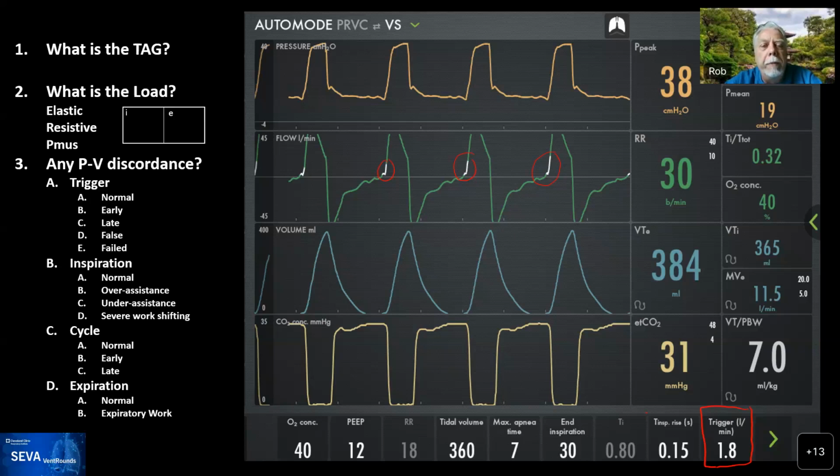Could you explain that? Yeah, so when you see over assistance, what you see is the waveforms for the next breath are occurring during expiration, and so the tidal volume that the patient got, they are still trying to exhale. So there's in a sense a form of auto PEEP, Rob, but it's generated by large tidal volumes rather than resistance in the airways. Right.